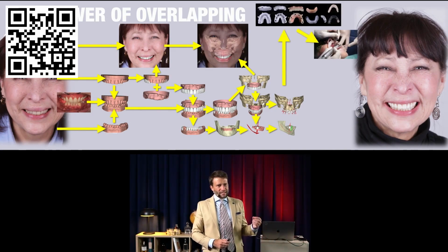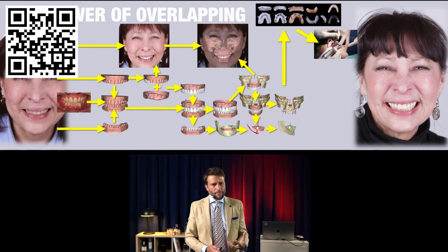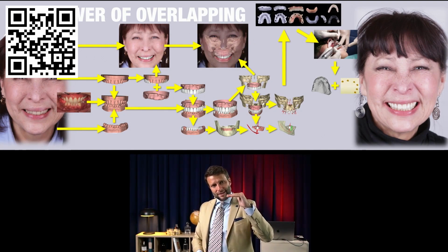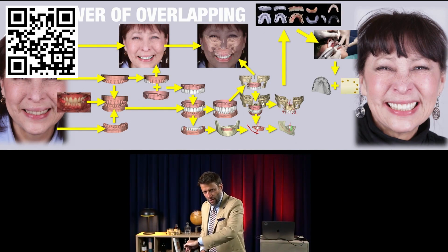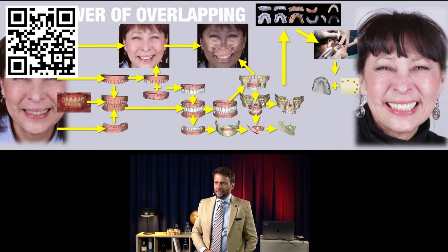When final surgery is planned, all the devices can be manufactured, surgery can be done, everything can be picked in the mouth, and in one shot, we can deliver an upper full implant bridge on the new design, and we can deliver lower composites on the natural teeth and the single implant that are perfectly integrating with the upper design.